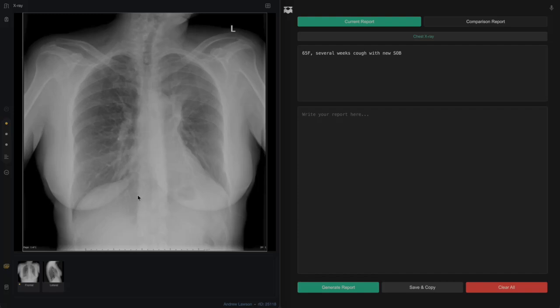And then looking at the rest of the patient, I can't see any pleural effusion, there's no pneumothorax, and there's no aggressive bone lesion here. I can't see an obvious mediastinal mass on this chest x-ray, but of course something could be hiding in there. So let's write a report.